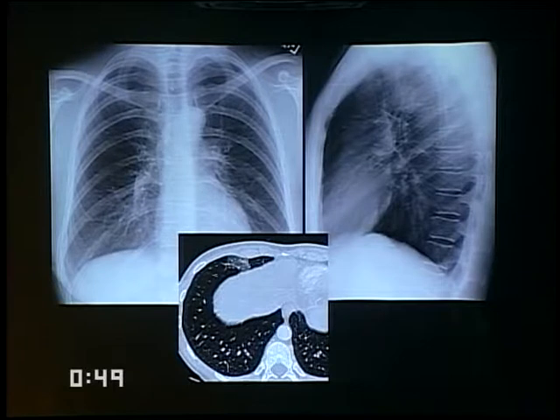And we just found this little patch of ground glass opacity, which is just anterior to the major fissure here in the middle lobe. I don't know what this is, but the scan was of good quality. There was no sign of pulmonary embolism, and I suspect that this was probably just an early pneumonia, perhaps even a viral pneumonia that was causing some pleuritic chest pain. This is the kind of thing that, of course, is completely undetectable on a chest X-ray in that location.